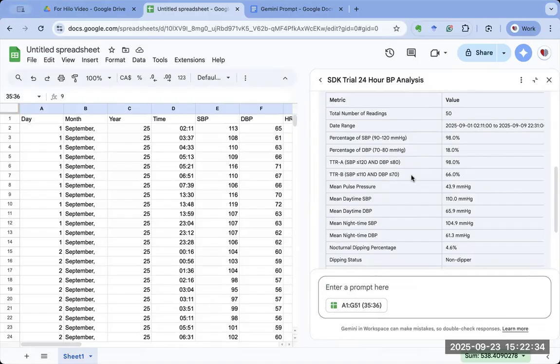However, in this particular report, as you remember, there was a discontinuity in between, there was no data for 7 days. This is again something that has not gone through very strict clinical trials yet. We'll have more trials later. What should be the time in target range for you? Do you need to be as strict as 98% in 120 by 80? This is again, it depends on many different factors.